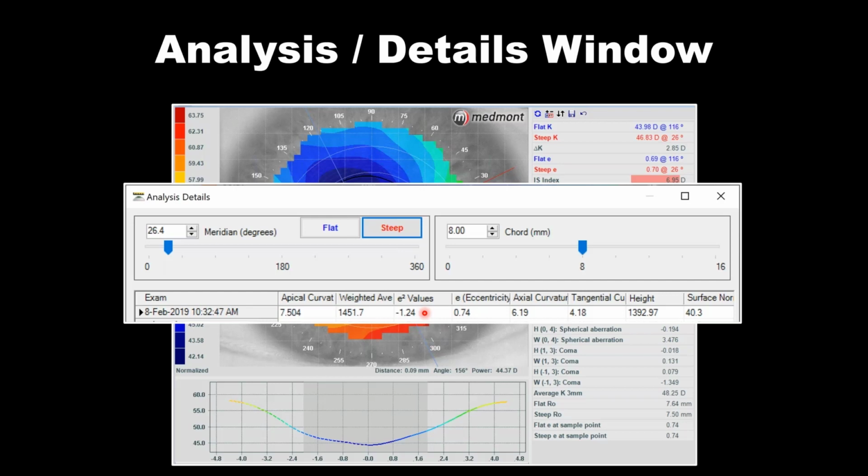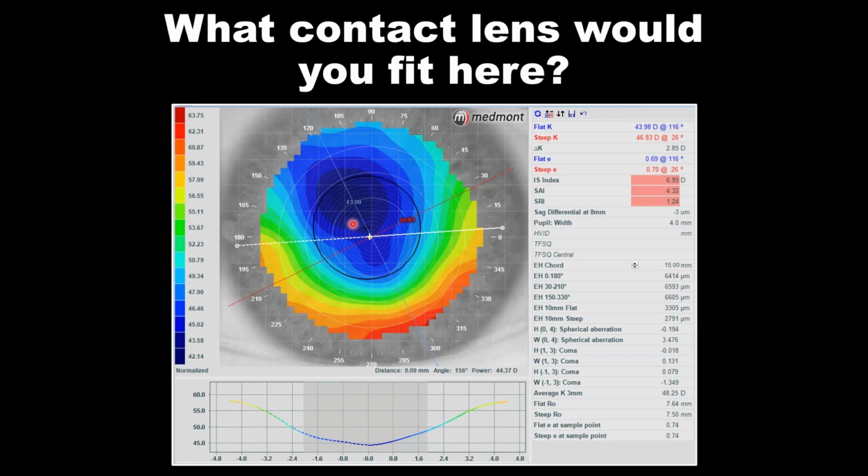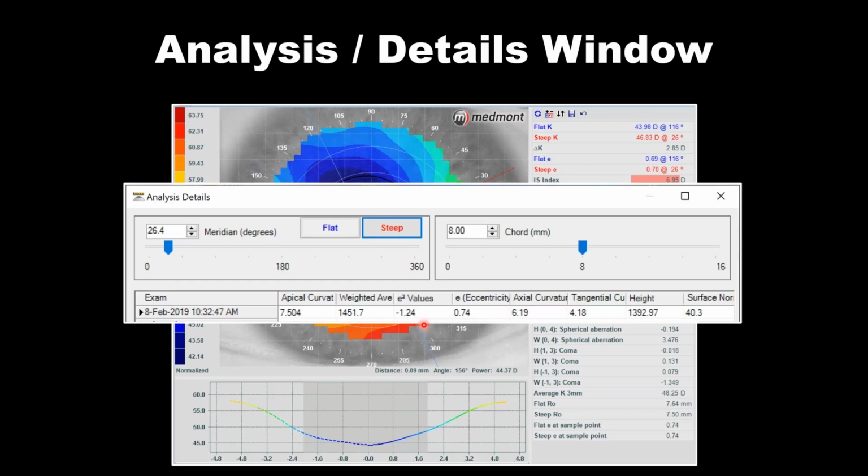and I'm a little bit worried that a corneal GP on this eye might struggle. We often find with our transplant patients that creating that appropriate lens to surface relationship is challenging for creating a comfortable fit. And certainly with this eye being at a very tilted graph, remember the elevation map told us this is an incredibly high point up here, and this is an incredible low point, a cliff, basically. So this is going to be challenging in rigid corneal GP lenses.